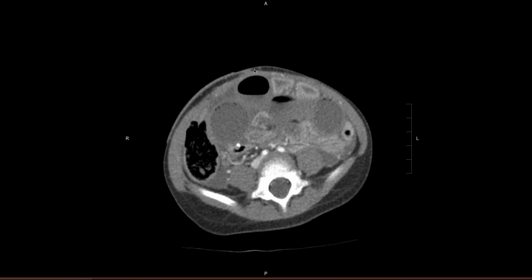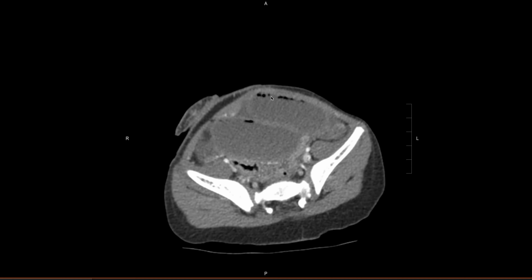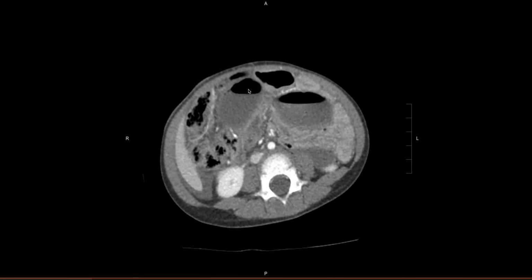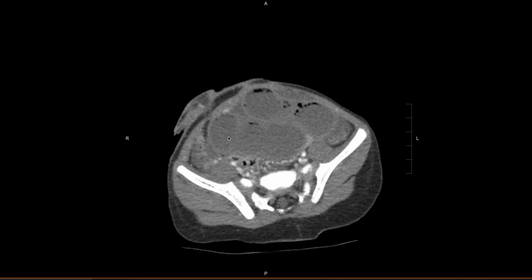So you want to make the diagnosis of a presumed closed loop small bowel obstruction, and you want to comment on suspicion for bowel compromise. And actually, this case went to the OR. There was an adhesion here that was causing the closed loop, and there was a short segment of necrotic bowel with larger ischemic bowel that was resected, and luckily it was only a short segment. The rest of the bowel was able to be reperfused and saved. So this was a great case of closed loop that had ultimately a favorable outcome because the diagnosis was made quickly on call.